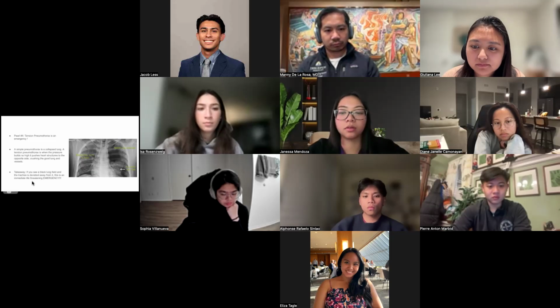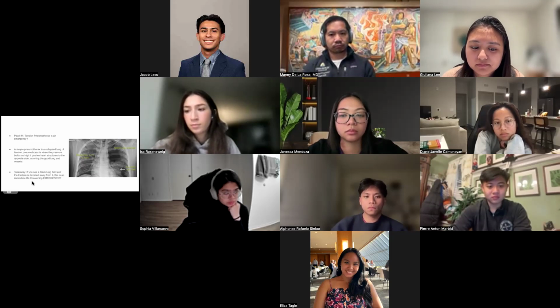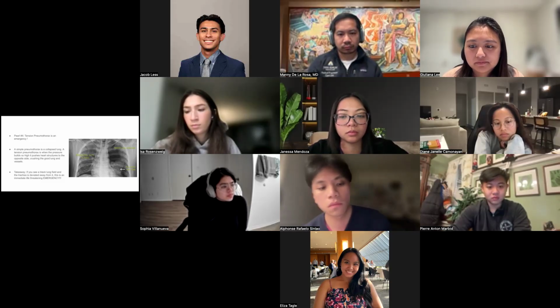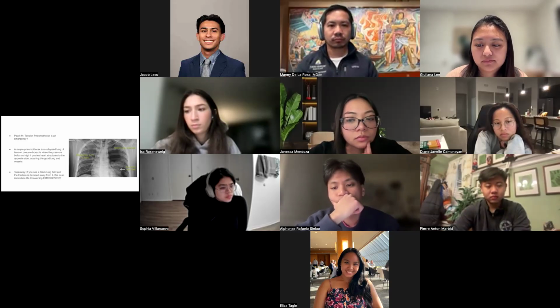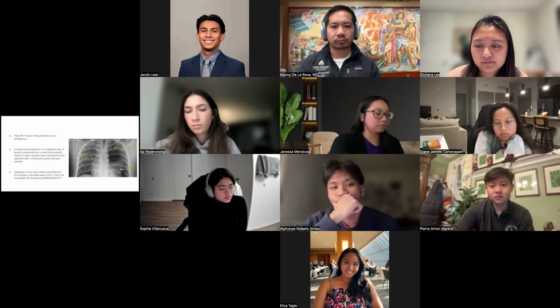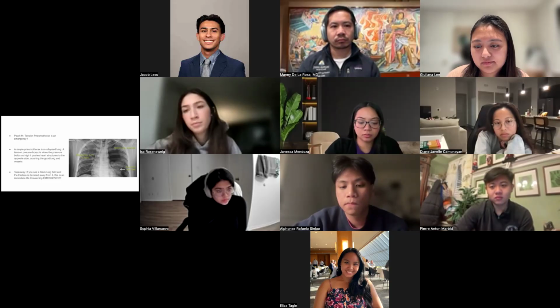And then maybe the last one is tension pneumothorax. Just some of the classic signs that you'll see. Again, it's an emergency. We've talked about pneumothorax, hemothorax, but we've also mentioned simple and tension. So a simple pneumothorax is a collapsed lung. A tension pneumothorax is when the pressure builds so high, it pushes the heart and other structures to one side, and that's when you get that tracheal deviation.